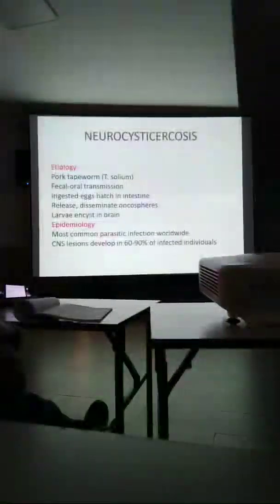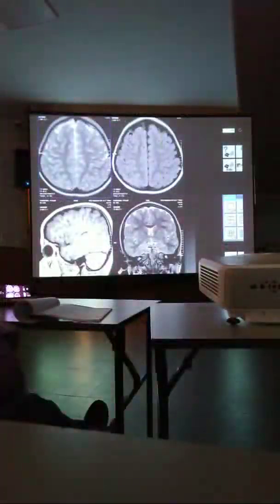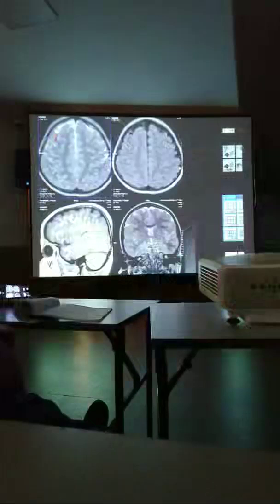Neurocysticercosis. There are 4 stages of neurocysticercosis: vesicular, colloidal vesicular, granular nodular, and nodular calcified. One is the live cyst. In a typical live cyst, there may not be any edema at all. Marginal scolex is the typical appearance. You can see the marginal scolex, no edema.